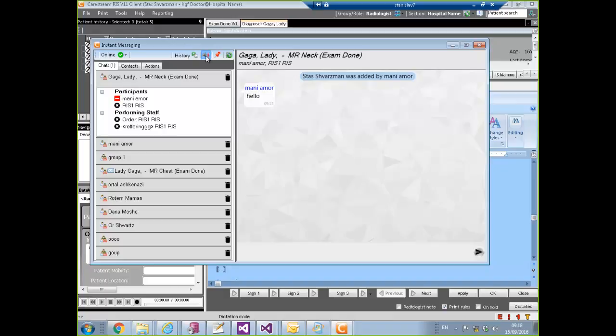Okay. Here I have a mute or unmute for the notifications that I get. When a message arrives, in some cases the user will hear a ding notification to know that a message has arrived, but it can actually be disturbing for some users, so a user can mute. Yes, and it can be saved. So if someone wants to mute it forever, he doesn't have to press mute every time he gets into the chat. It's saved. Everything is saved in user preferences.